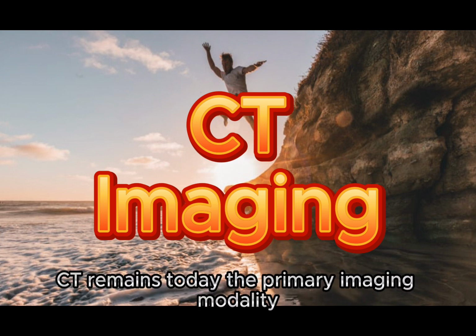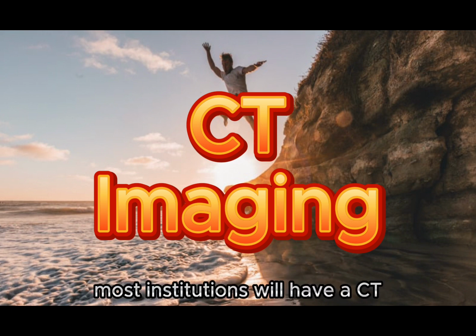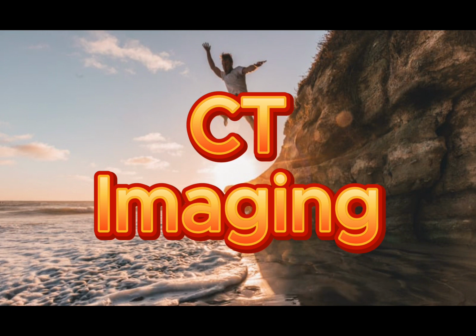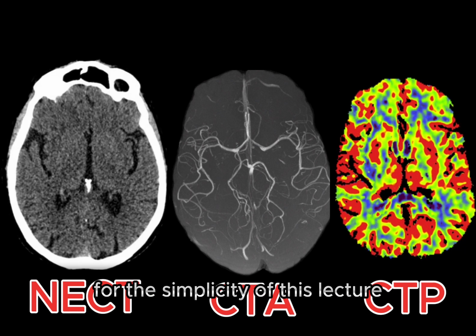CT remains today the primary imaging modality. Most institutions will have a CT stroke protocol in place. These include a non-contrast CT, CT angiogram, and CT perfusion. For the simplicity of this lecture, we will focus on the first two.